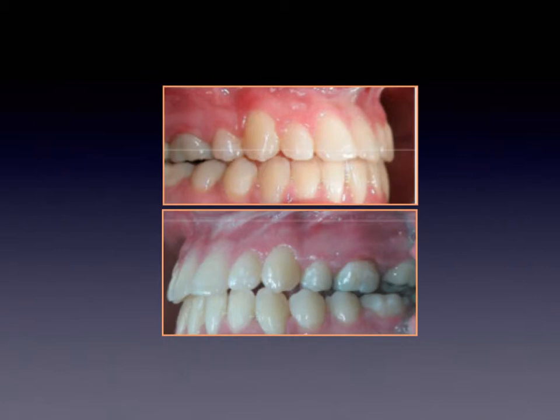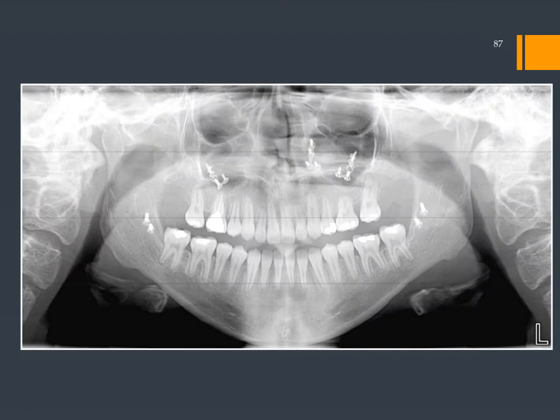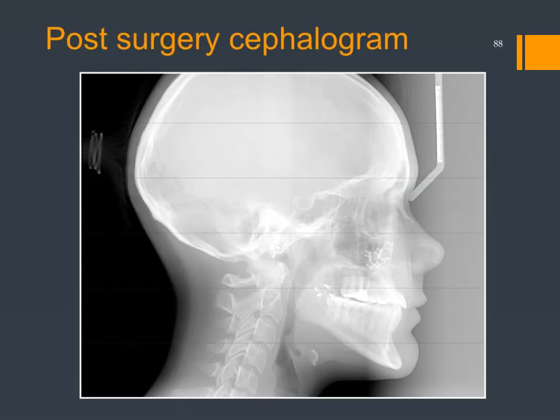I mean, it wasn't really a great finish occlusally, but lots of good facial change, and the pano looks decent. You can see the bone levels aren't bad. And then when you look at the head film, this is right when we got our first CBCT, and the attending looked at this and said, whoa, it doesn't look like there's much bone there. Let's get a 3D x-ray.